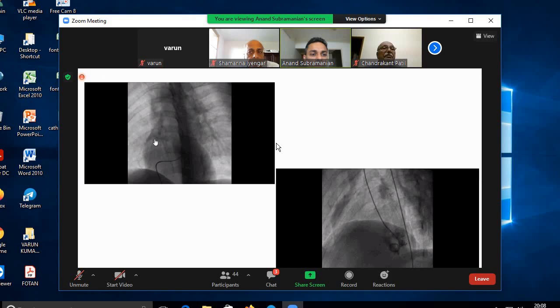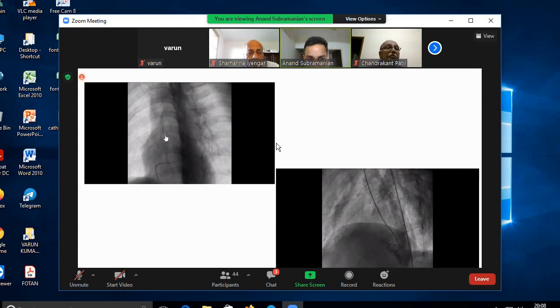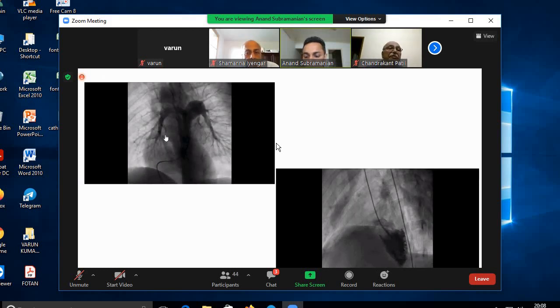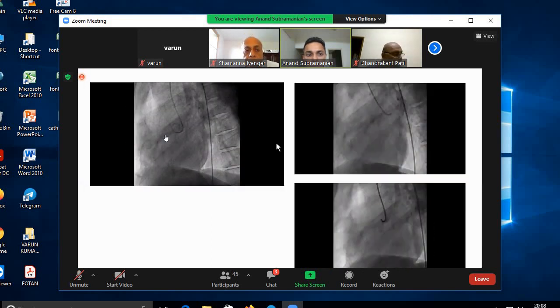And if you just wait for some more time, what you notice on this angiogram is you slowly start seeing the pulmonary venous return in the levo phase. That's not very well appreciated here. So these are the essential things which you would look for in any VSD PS or a TOF angiogram in an older child. So moving on to the next slide.